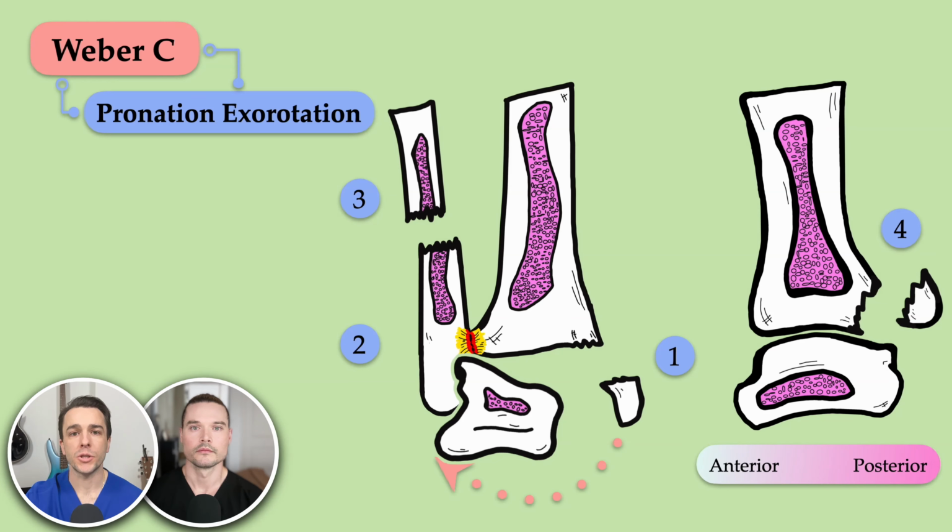When you have a posterior malleolus fracture, it's extremely rare to have that as an isolated injury. So you have to be on high alert and really be hunting for these other really subtle, sometimes just ligamentous disruptions that could make this a severely unstable ankle injury. 100%. All right, let's go to our example.